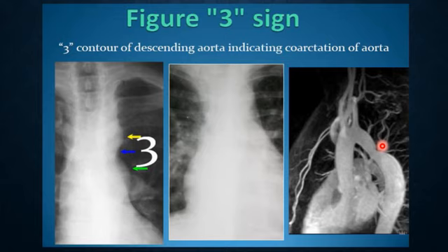However, just quickly, the rib notching indicates which type of coarctation, pre or post? If bilateral, postductal. Bilateral rib notching, inferior rib notching indicates a postductal coarctation, which is the most common, and they survive due to the collaterals. Preductal is severe and they usually don't survive, or they need immediate intervention. Okay? Because there are no collaterals to compensate, or much fewer collaterals, let's say.